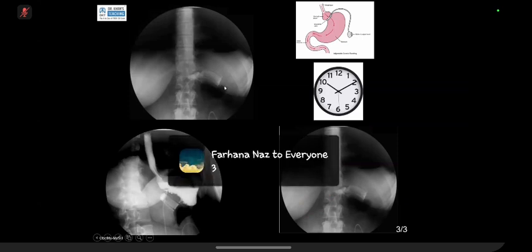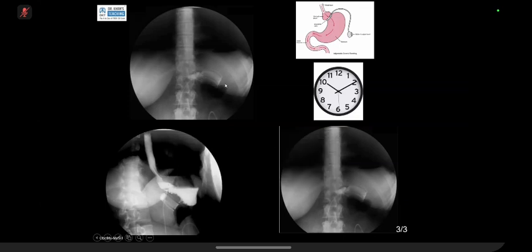Slip, right? This is now at about 10 o'clock and this is 4 o'clock. This is a slipped gastric band. In an emergency, we can pick it up on a CT scan because it's a simple o'clock position. And if it slips down, then the patient will present with obstruction.